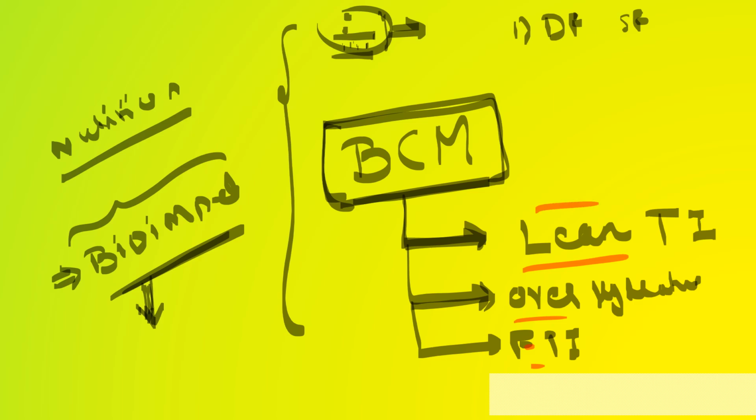In a dialysis patient, the important parameter we are going to see in the report is the overhydration: how much more water is there in the body. This is what most clinicians want to know, and this is why this report is mostly ordered, in situations where you have clinical doubt or some discrepancy in the patient's weight gain, quality of life, and nutrition. That is when we will order this report.